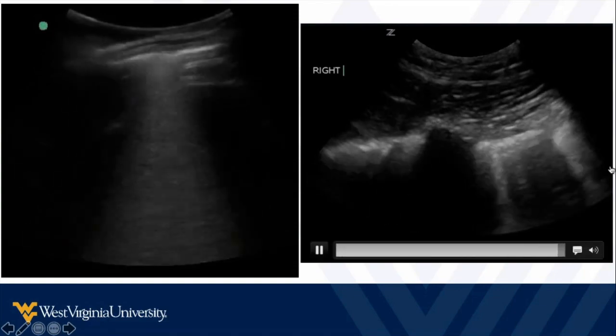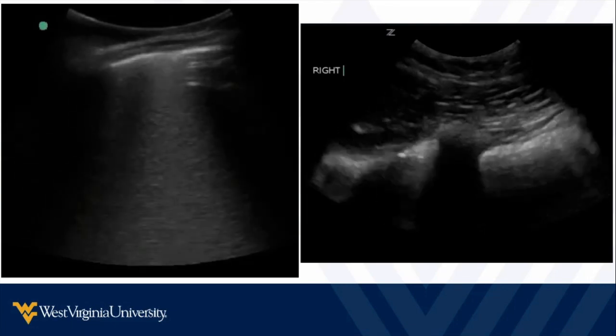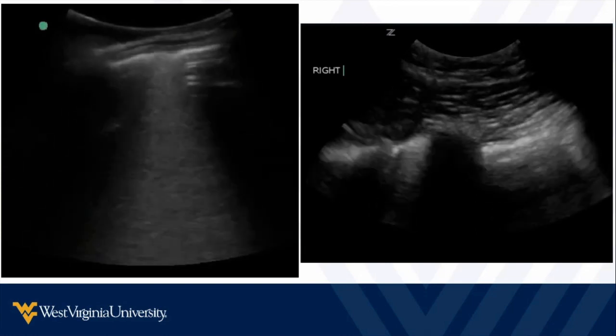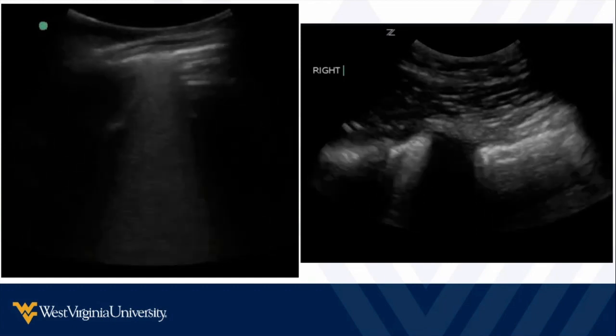These are signs of infectious or inflammatory things, as opposed to pulmonary edema, where the B-lines are very regularly distributed, they run together, and they're fairly symmetric. So that's one of the ways you can help differentiate pulmonary edema from infectious and inflammatory findings in the lungs.